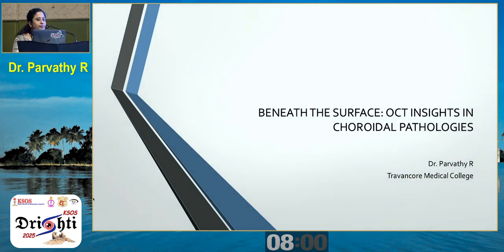Okay, good morning. Beneath the surface, OCT insight and choroid pathologies. Here I will be discussing the common diseases like dry and wet AMD, PCV and CSCR, the OCT features.